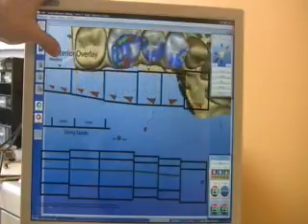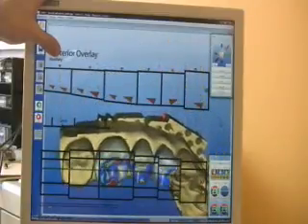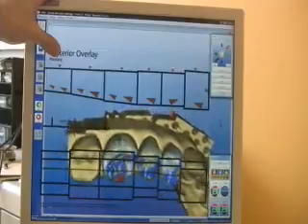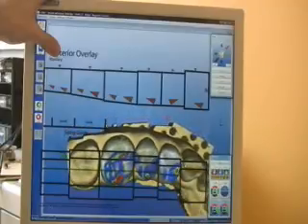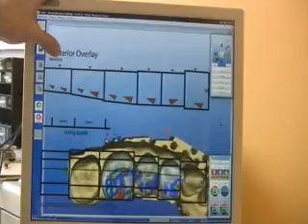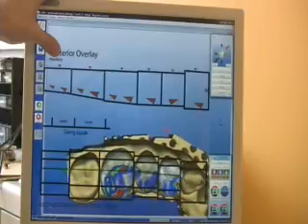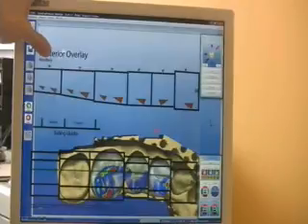When we rotate it over for the occlusal view, we slide it down to the occlusal part of the overlay. This will help us align the cusp tips of the proposals to be in good alignment. When you're viewing the SLA model from this, the bumps that you see on the anterior teeth is the liquid reference that was used to help with stitching.